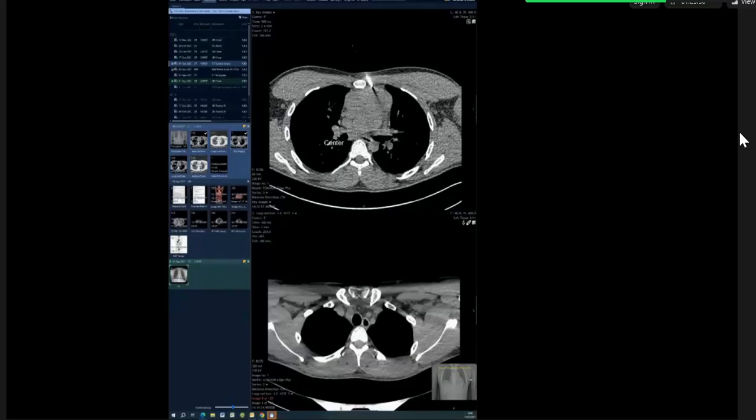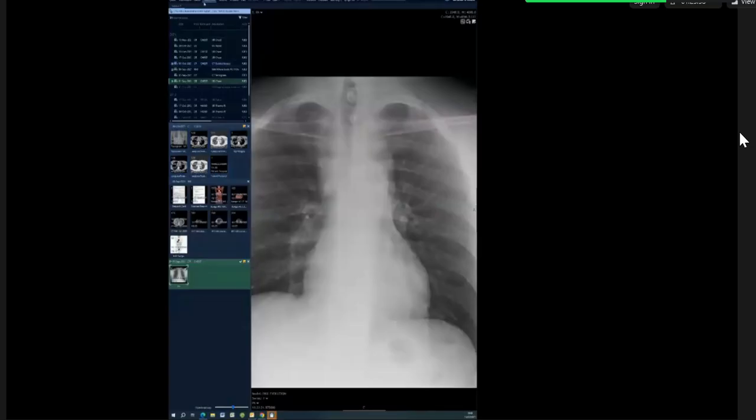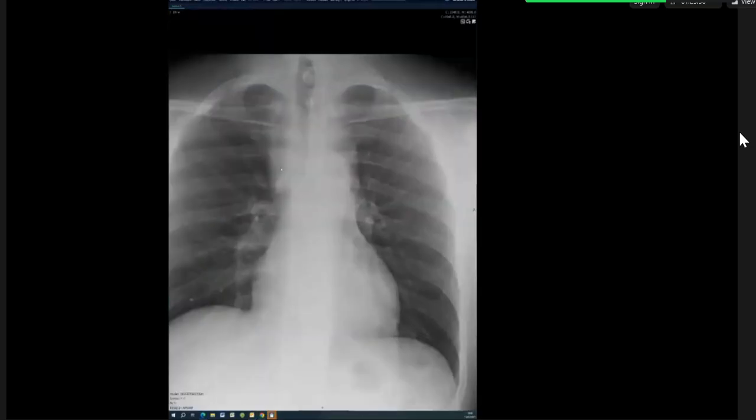Did you want to ask me anything before I move on to the next candidate? Sorry, what was the thing you said on the chest radiograph, how to maximize the points? You said something about the apex? This one? Yeah, what was that again? It was for posterior mediastinum. You usually see them tracking up. Yeah. So this one is very lucent here.